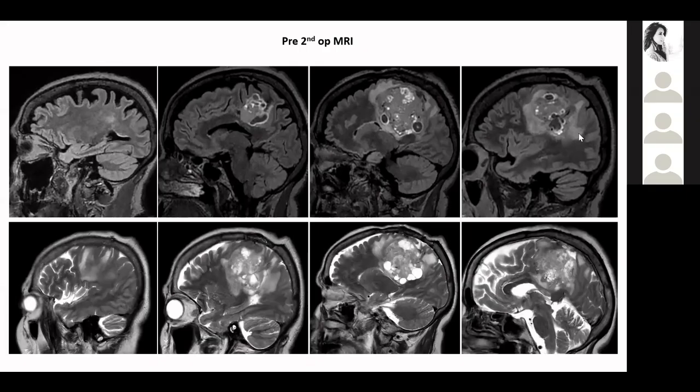Then the lesion is causing significant compression as well as crossing through the corpus callosum. So possibly it appears to be it was initially extraaxial, but now it seems that it is infiltrating the brain parenchyma, because we can appreciate especially the last image in the last row, which are T2 weighted sagittal images, in which we can appreciate the corpus callosum, and we can see that in the distal half of body of corpus callosum, the signals are different from rest of that.